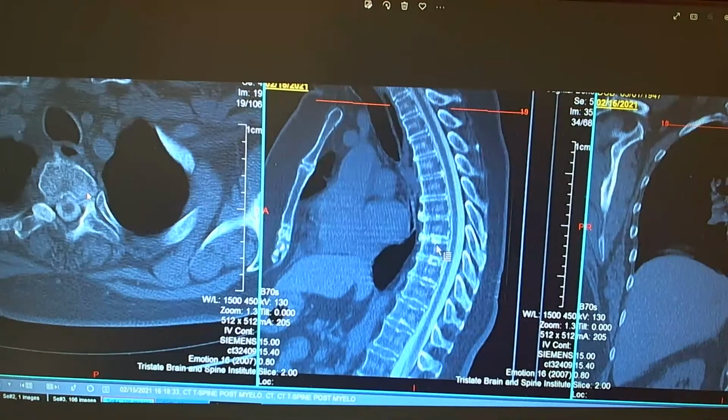And I think, and I'm not sure about that, but look at that. That seems to be the cut, and it seems that structure uses other cuts to identify. This is what I'm trying to tell you. If you are not sure about one cut, go up and down, correlate it with other cuts. In this case, you might be right, Christina.